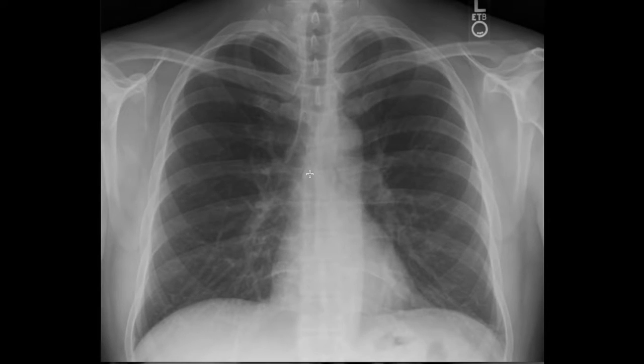So let's go back to our chest radiograph, since that one is labeled. We can see right here, this is again the left ventricle, this is the left atrium right here, then you have here the right ventricle down here, and this is the right atrium right here. Then you have the vascularity. Again, into the right atrium right here comes in this dense line. You can see it right here. This dense line is the superior vena cava, the SVC.